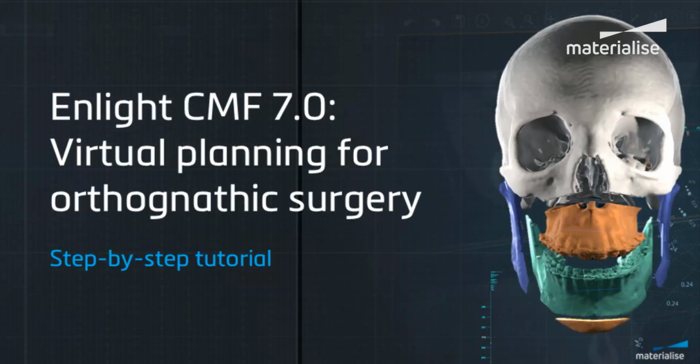In this tutorial, I will show you how to virtually plan an orthognathic surgery case using Mimics Enlight CMF. Starting from the CT images and dental casts, we will go over all the steps needed to plan the case and in the end design a dental splint.